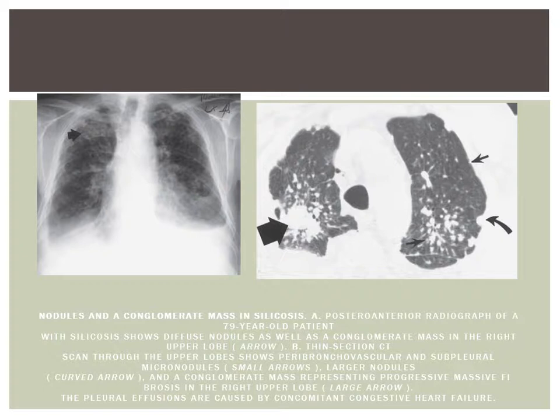And in the CT scan, you can see there is a big mass-like lesion. Otherwise, we would consider it a tumor, but in this case, it is not a tumor. It is just fibrotic, PMF, progressive massive fibrosis, a large mass-like lesion. Usually it is bilateral. Here it's more on the right side, but usually it happens bilaterally.